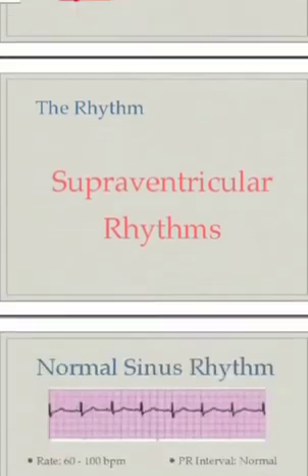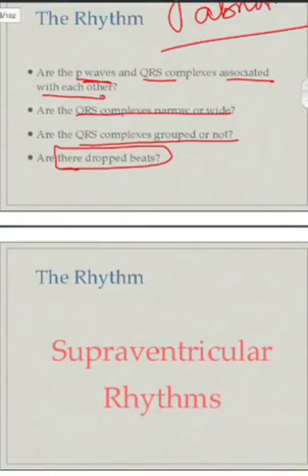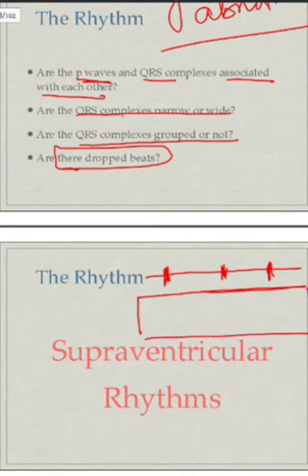To check the rhythm, suppose this is an ECG, and on it this is a QRS complex, this is a QRS complex, this is a QRS complex. You take a piece of paper and mark with your pen a point where there is a QRS complex here, and then here. If you slide this paper forward, and it also corresponds to this, if this distance and this distance are the same, then whether you slide it right or left, this line will always correspond to a QRS complex. That is how you check the rhythm.